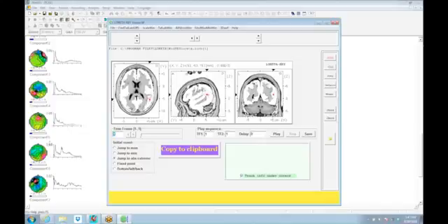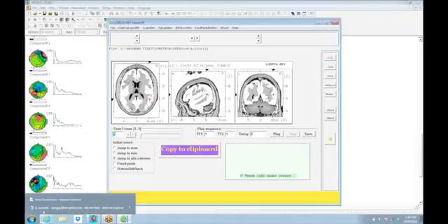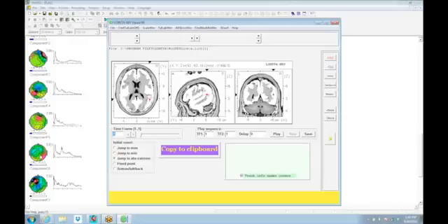And let's say that this was a component that we were trying to get rid of, a right temporal alpha in an Asperger's autistic client or something. If we had done training, this component will either disappear off the list, or instead of being component 15, it will drop down the list as it becomes weaker and weaker. And this only is 2-point-something% of the variance of the EEG the way it is. So it's not a big component in the first place.